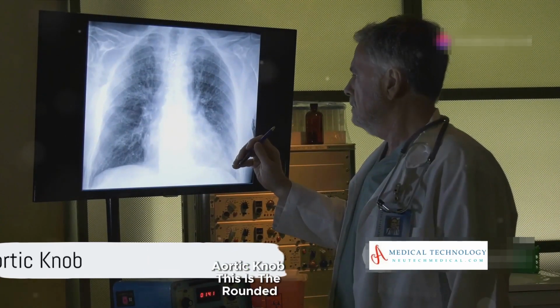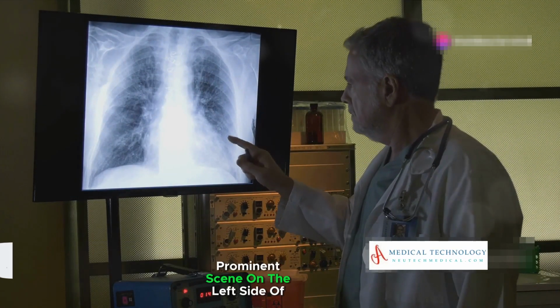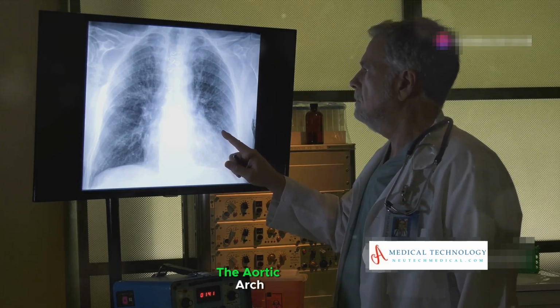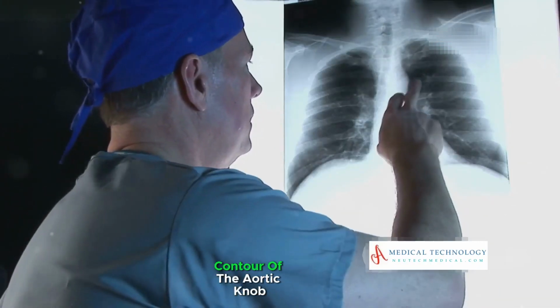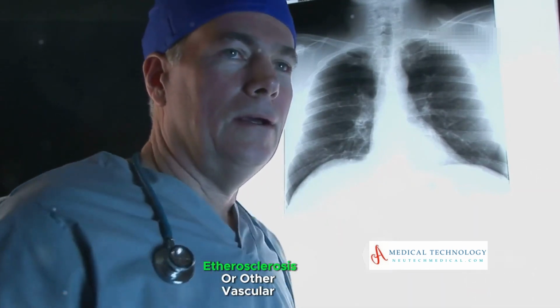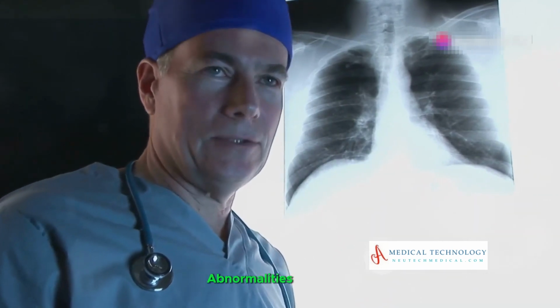Aortic knob. This is the rounded prominence seen on the left side of the mediastinum. Significance: it is the contour of the aortic arch. Enlargement or abnormal contour of the aortic knob may indicate aneurysms, atherosclerosis, or other vascular abnormalities.